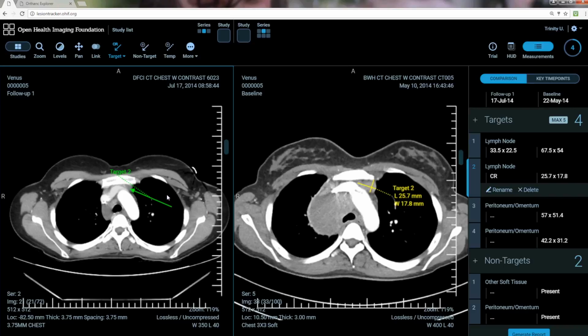In the case when a lesion is not imaged or can't be evaluated, use the Unknown Target tool. Continue adding targets and non-targets to the follow-up until all disease has been assessed. This icon will display assessment progress. 2 out of the 6 lesions, including targets and non-targets, have been assessed. This displays the total targets that are measured on baseline.